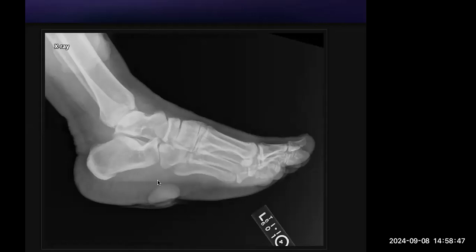Don't get carried away by a single lesion, because in this case we have another lesion, and that completely changes your set of differentials. In this case, you gave me melanoma, you gave me sarcoma, and maybe you can always add a lymphoma to it, and also other metastatic deposits. But then this turned out to be melanoma.